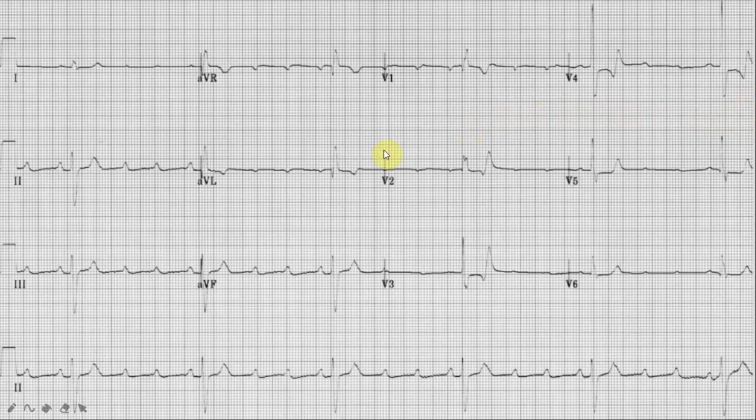Thank you. Oh, no. This is another complicated ECG. Still, I think I'll give it a try. Yes, please. As always, let me interpret this ECG in a very systematic way so that I don't miss any important piece of information. The elephant in the room in this ECG is non-conducted P waves suggestive of a second-degree heart block. I will come back to it in a second.